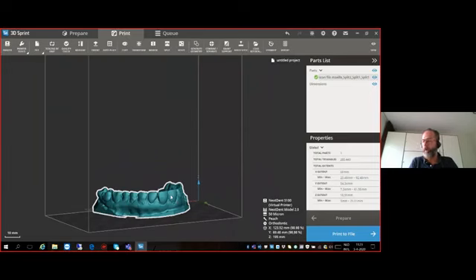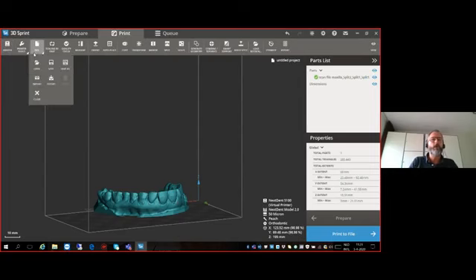So you can see that we have now used several options here. Of course, we have the printer with the selection of the material. We have the file. Another thing I would like to point out is that the import button is the most important one, most frequently used. If you close, the job will close, of course. If you open, you are browsing in your files. But here are 2 other options which are sometimes very useful.